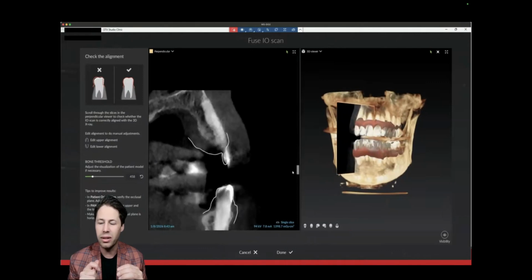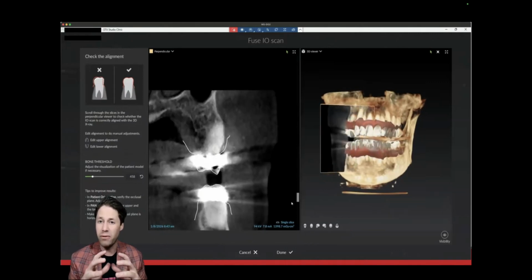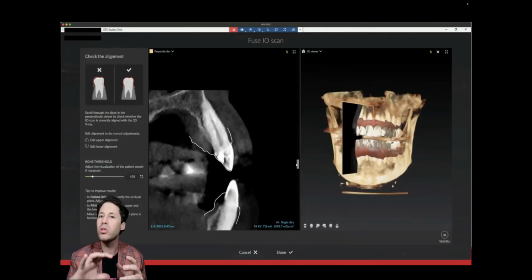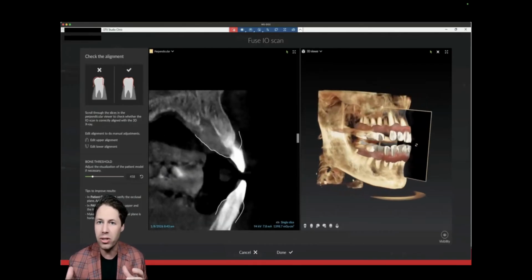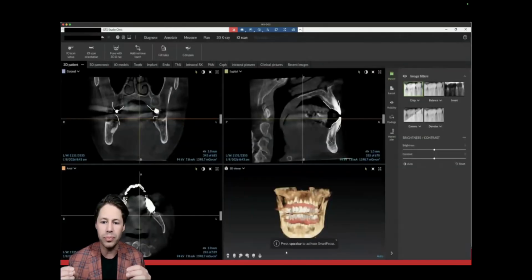It's planned, and those files are overlaid. So now I'm seeing the soft tissue, the gum and bone, and the proposed tooth form over the missing tooth, to see how much bone you have, and whether I need to do any extra bone grafting when we place the implant, or whether it is a relatively straightforward implant. So now we've overlaid, or merged, the two data sets for you.